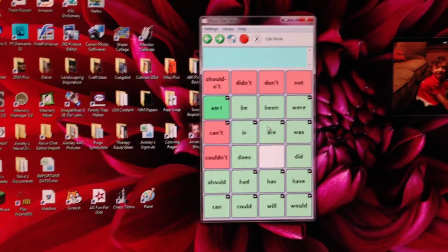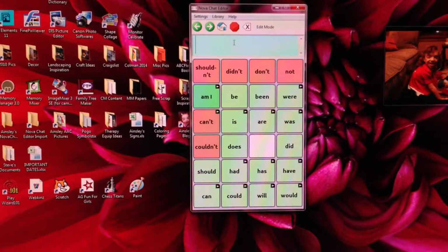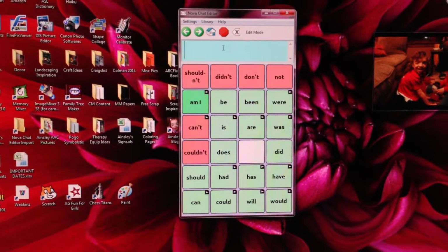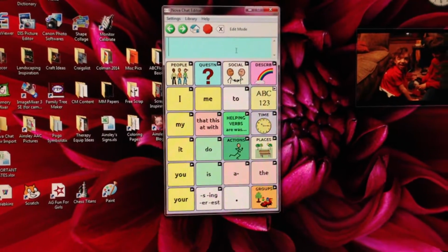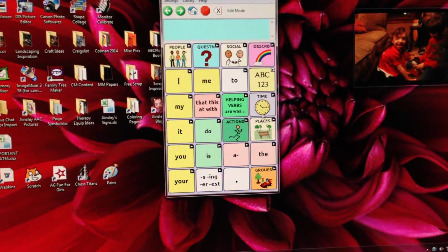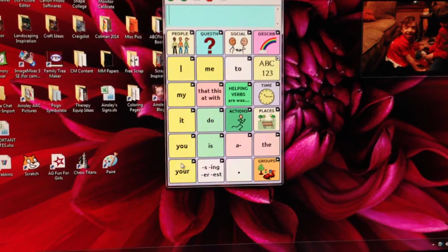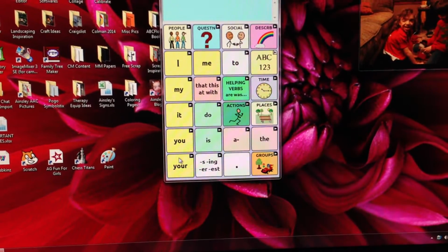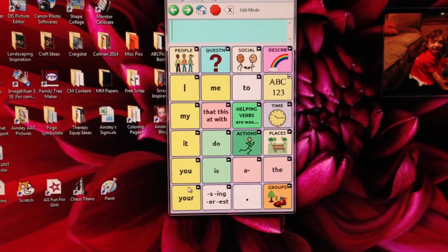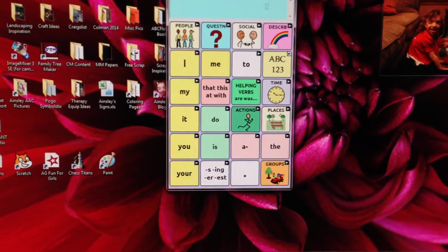And the Ainsley School has asked that we have one. So the other reason that we are switching vocabularies is to be able to go from 24 up to 28 and more easily add a home button on each of the pages where it's needed, which is pretty much all the pages. So that is what I wanted to show you, is how in this vocabulary the home button is not there, and in order to add it, you're talking about additional customization. So we need symbols, we need a home button, and ideally a landscape orientation is more ideal because you can also fit more symbols on the display.